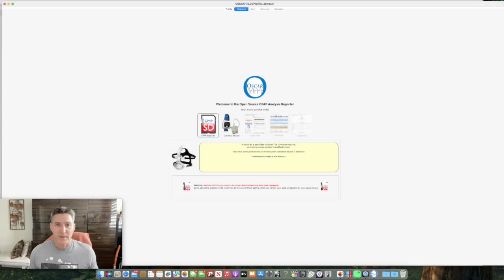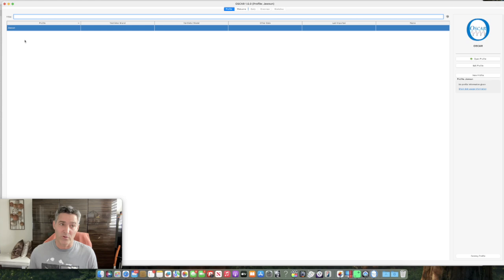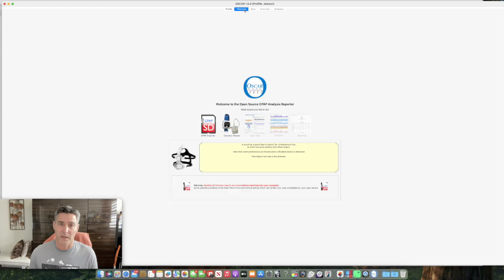So this is like the main welcome screen. You'll see welcome is highlighted up at the top. Daily overview, statistics, all grayed out. You can't select those. I can go back to the profile screen. I can see that my profile is right there that I just created. So I want to open it. What's going on? I can't do anything. Okay, what you have to do is actually import your data at this point.